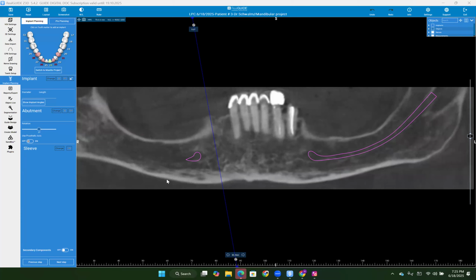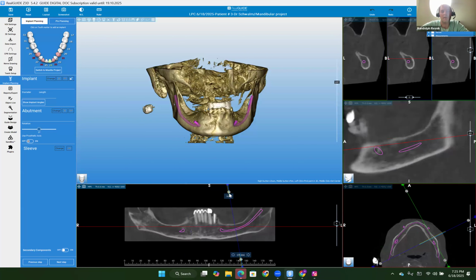I think that's great. I had planned on implants. Perfect. And then what we can appreciate from this view that Hussein just had the line out there is you can see, as you mentioned, where the posterior ridges have resorbed significantly there. So kind of the level of the cortical bone in the posterior, it's really sunken down there. So we'll go through the cross sections, but you'll be doing the alveoplasty, as you mentioned, to the level of the posterior there to gain the necessary space. And if I recall, I think she has some tori on this one as well.